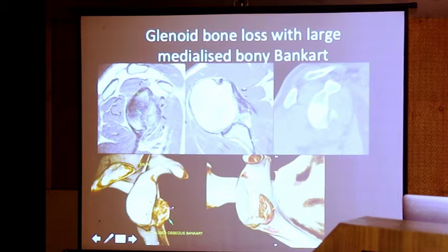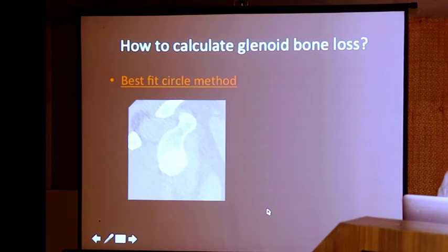So this is my glenoid articular surface, and this is the osseous Bankart lesion. A 3D image to show you the glenoid articular surface, and what you see over here is the osseous Bankart lesion. But this Bankart lesion is large, but it is medial now, and so it is not going to help the humeral head in articulation. So here you can see an oblique image where you can appreciate that my glenoid articular surface is more lateral and my Bankart lesion has gone more medial now.